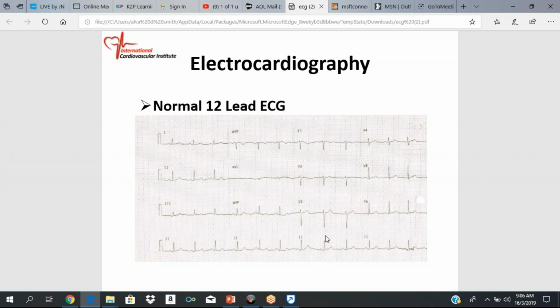The dark lines represent big blocks. So the space from one dark line to the next is a big block. Next, there's another big block, another big block. Each big block has 5 small blocks inside.